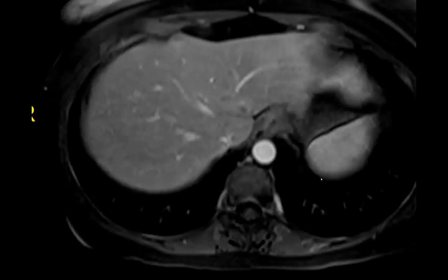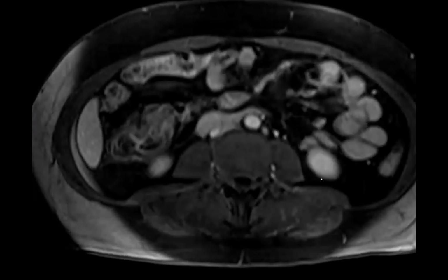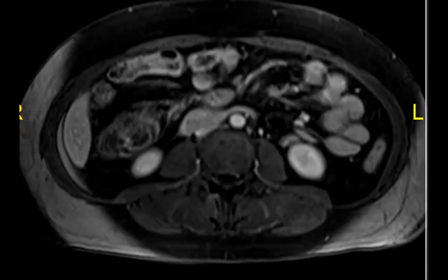About the mesenteric mass. Victoria, if you can go down there. Yeah, so this is a really high nodal met. It's going all the way up to the confluence, which is really unfortunate because normally they want to resect the primary tumor in the ileum and the nodal met. But when it goes all the way up like this, it's taking out too many branches for it to be resectable. So in this case, it's really important to describe how much of the mesenteric vasculature is involved and to what level. And if it goes up too high, those are the ones that basically can't be resected.